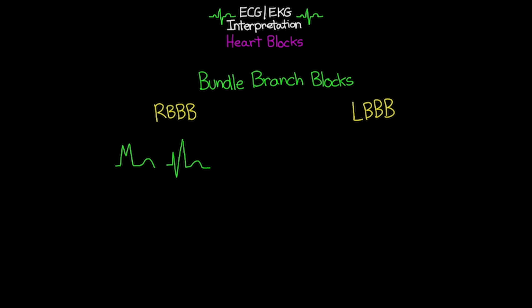So in this first example, we've got the left side depolarization happening here, while this entire thing is the right-sided depolarization, whereas in this other example here we have our left-sided depolarization all within our right-sided depolarization.